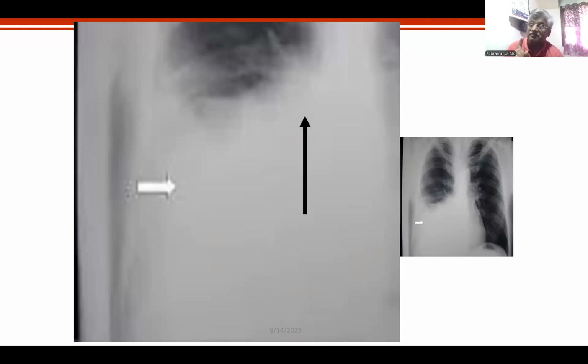This is not taught many a time to pediatricians to recognize pleural effusion. Really, I'm telling you, nobody teaches you pleural effusion. Everybody teaches you lateral ascent. Lateral ascent will happen only when there is large or moderate effusion. All of you have problems of minimal effusion, small effusions.